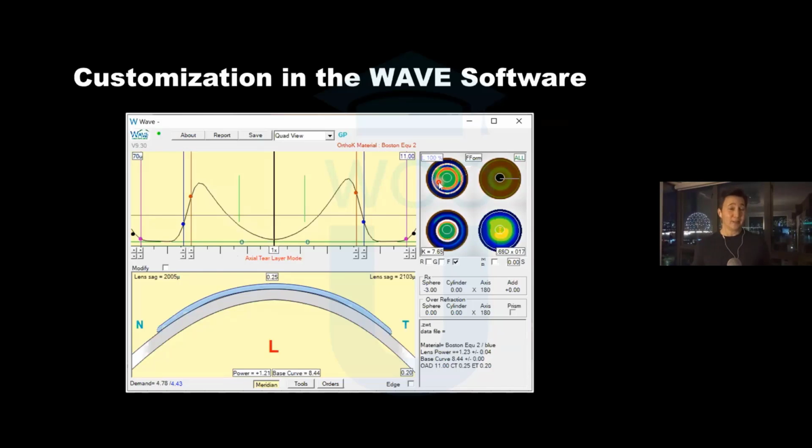And if you're relatively new to lens construction, if corneal GPs are not something you feel particularly strongly about being able to build, and certainly a reverse geometry lens, the Wave software makes it pretty easy with a few clicks for you to construct one of the most advanced contact lenses available on the market today, with a landing that's specific and customized for each eye 360 degrees around. What makes me geek out a little bit is the ability to control these data points, which is brilliant.